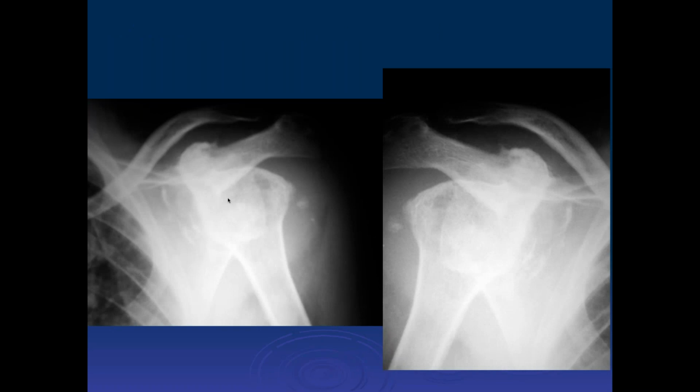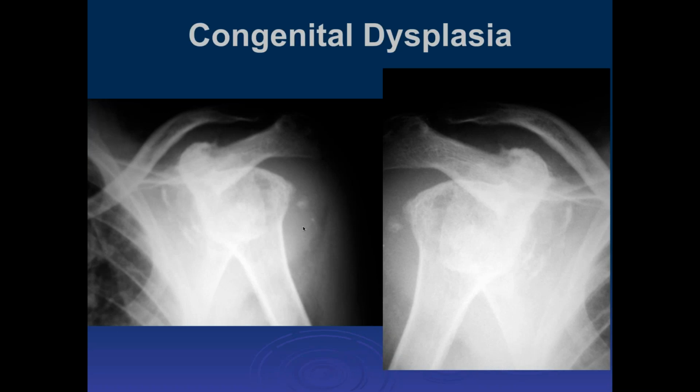Okay, so there's a bone remodeling of the humeral head, and also I see some ossification superiorly. Yeah, these are all for chronic instability and ossifications. And this was a case also of congenital dysplasia, where even on multiple plain films you can't really see it well, but you don't see the normal anatomy of the humeral head and glenoid here. And that was congenital dysplasia.